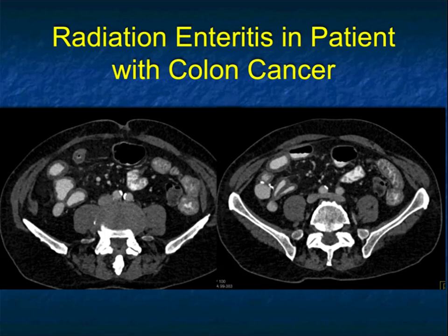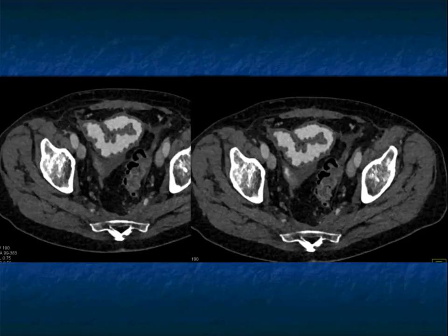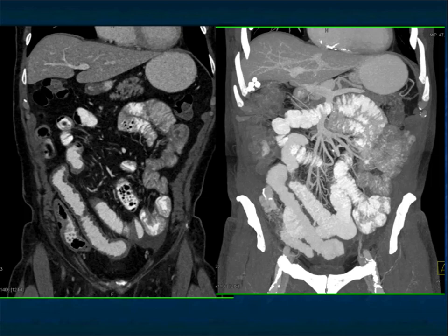They commonly will dilate in part because patients could develop adhesions. And you can have long segment involvement, but again, the involvement tends to be in the area where the patient had radiation therapy. Outside of the therapy port, you can see dilated bowel, as you can see in this example, because simply what happens with radiation, the bowel also develops strictures. And again, a very nice example of the terminal ileum and the extent of involvement in the patient post-radiation therapy. Another good example, same case, the axial images, the coronal images, nicely show you the process really focused in the right lower quadrant. And here's another example showing you the same thing.